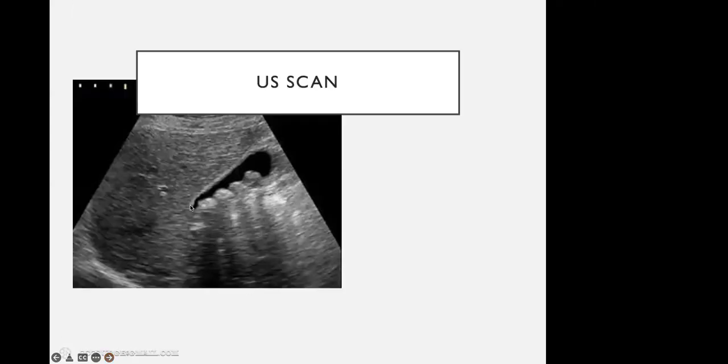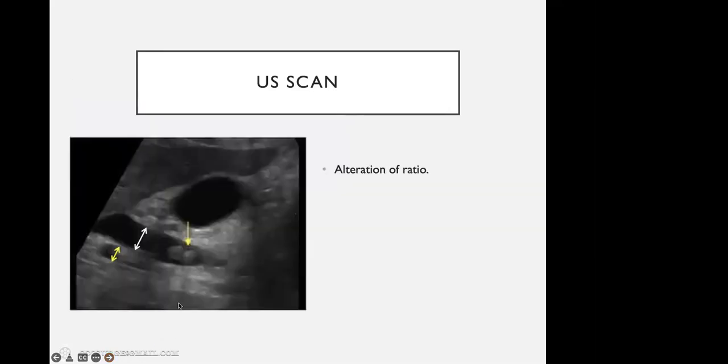This is the gallbladder on ultrasonography. This is the gallbladder stone, how it looks. And here, this is the CBD stone on ultrasonography. In ultrasonography, again, the fluid is black and the stone would be brighter. So the fluid is hypoechoic or anechoic, as I told you, we will correlate with the echogenicity. The stone is bright or hyperechoic.